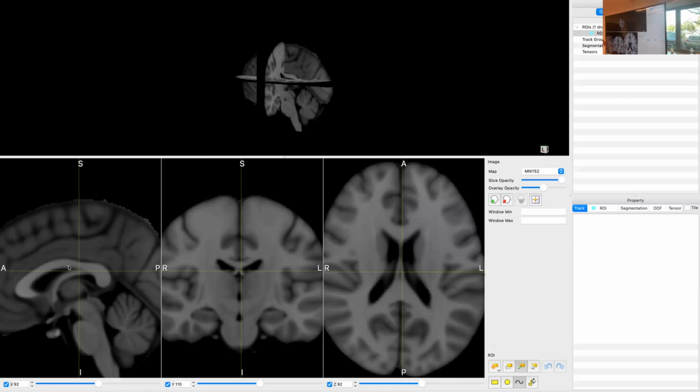What's right on top of the corpus callosum? Cingulate. The cingulate. What's the white matter in the cingulate? Cingulum. Cingulum. What class of white matter is it? It has to be association. It has to be association, and it is association. So your job now is to stay very cleanly within the white box of the corpus callosum. Okay? And I'm gonna do that here.